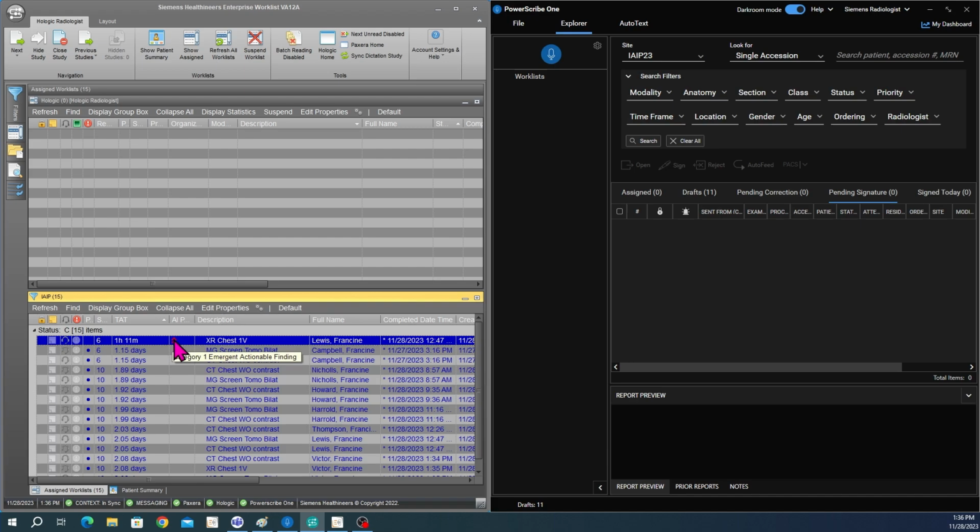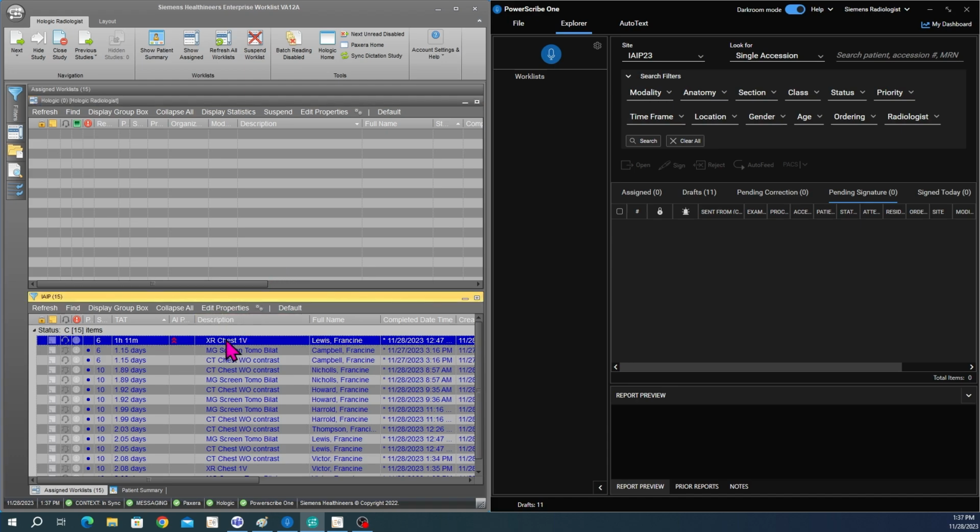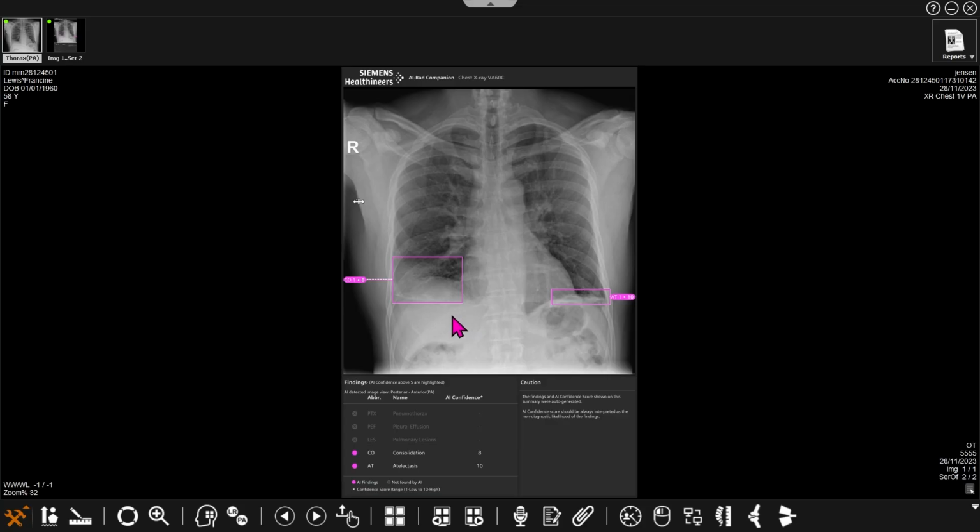Okay, back to our radiologist in the busy shift. The radiologist notices that the study has been prioritized to the top of the stat list on the Siemens Medicalis Workflow Orchestrator work list, and is marked with an AI flag suggesting a critical finding. The radiologist clicks on the chest X-ray on the list and on the AI result.